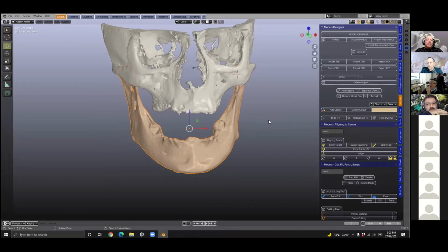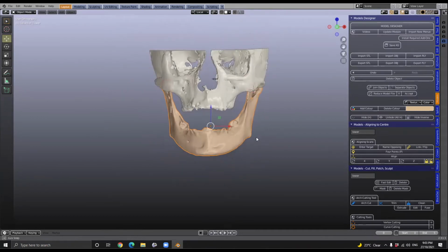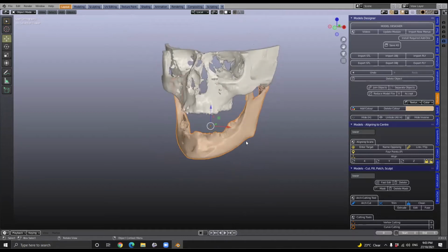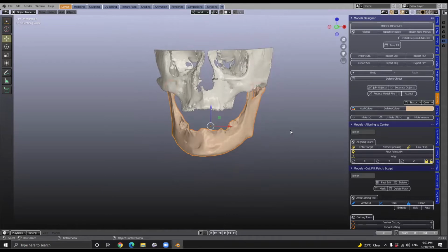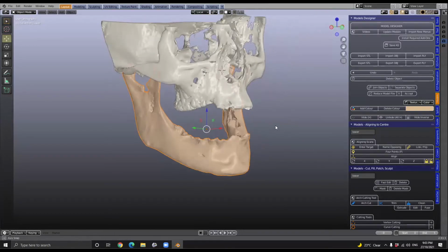So the articulator, which is like a virtual jaw, condyles we call them, we bring those into the scene. Now, this is just a brief discussion of why we did what we did. We're moving the lower jaw. A lot of digital software moves the upper jaw, just like a mechanical articulator. And when we designed this, we thought, no, this is incorrect. We need to move the lower jaw because otherwise the head would be bopping up and down, always saying yes, yes, yes, and that was not the way to do it.